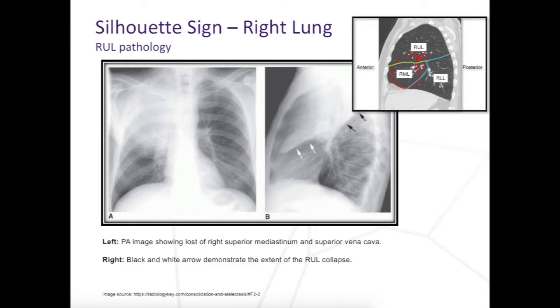Then you can see there on the lateral view the actual fissure, and you can see the actual condensed lung here. For whatever reason, the lung has collapsed, so it's pulling the lung towards itself. At the moment there's no pneumothorax, none of that kind of stuff. So the lung is just opaque and white at the top here.